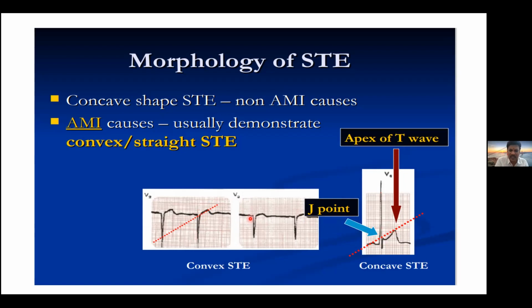If the ST segment is above the line or going along the line, it is due to acute MI. If the ST segment is below it, it is not acute MI. Another simple carry-home message: below the imaginary line from the J point to the peak of the T wave, concavity upwards, less likely acute MI. Above it, most often acute MI.